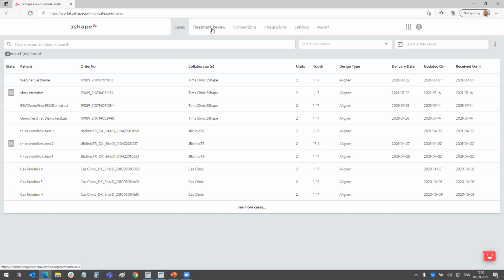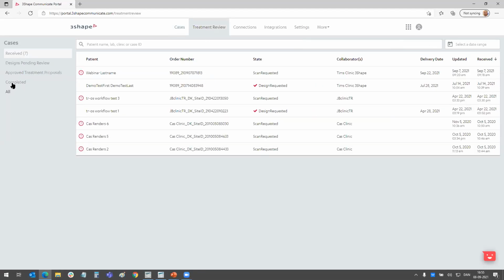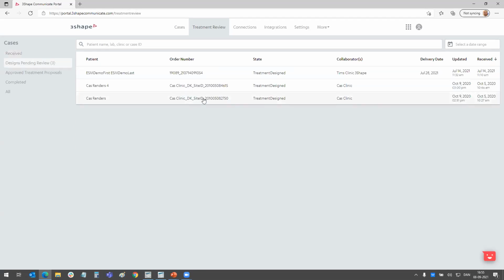I have now received a mail from the lab saying that a new suggestion is ready. Please take a look to see if you like it. So I click on treatment review. Out here, I can see design pending review. So here is where I find the cases where a suggestion has been made for me that I need to decide if I like or not.